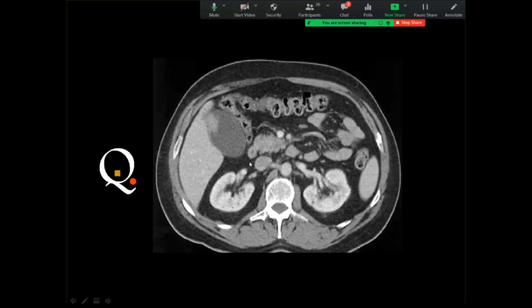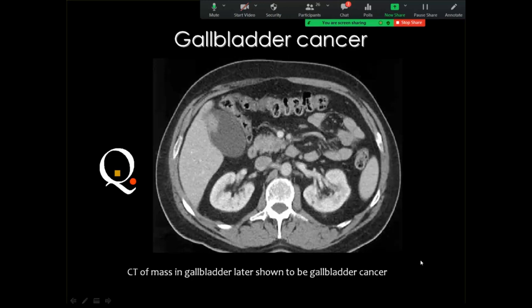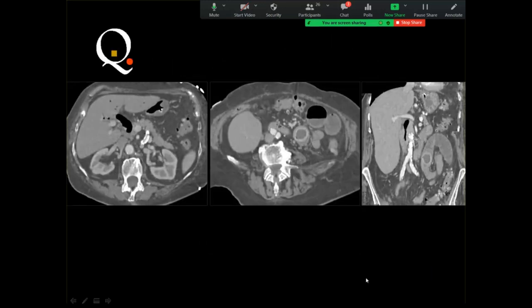And you know that gallbladder masses may be in the form of polyps or carcinoma or even metastasis. And we consider the polyp that is more than 1 centimeter in diameter towards the malignant side. Then we consider the possibility of gallbladder carcinoma, and if there is a known history of primary malignancy, you consider a metastatic deposit to the gallbladder.